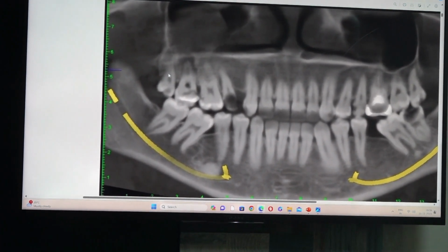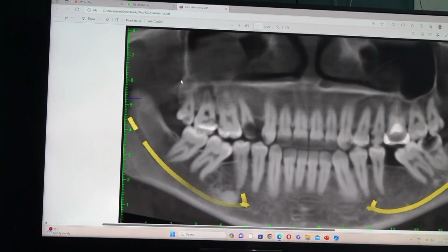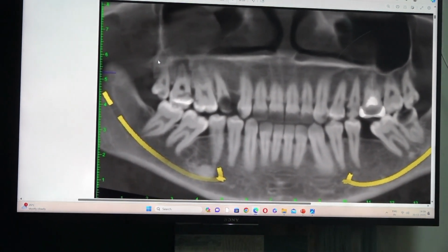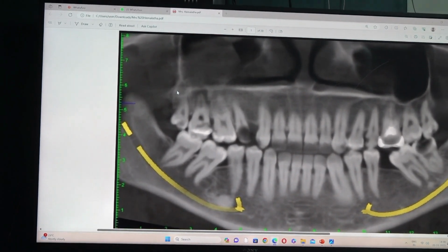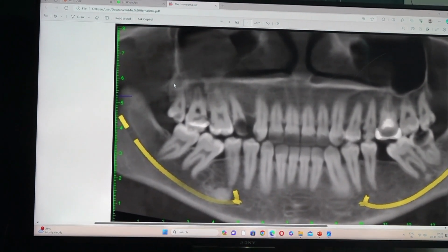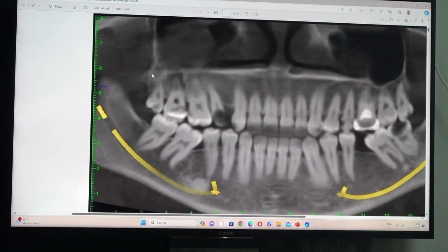But at 8 you can place a pterygoid implant. Don't go along the socket, tilt slightly distally and palatally. You will get a very easy pterygoid area. So the one implant is at 1-4. The second implant is in the palatal aspect of the mesiobuccal root. The third implant may be in the 7 palatal socket. Mostly it will be 5.5, 10 or 12. Any company will do, Implant and basal, 5.5, 10 or 12. At 8 you can place a pterygoid.